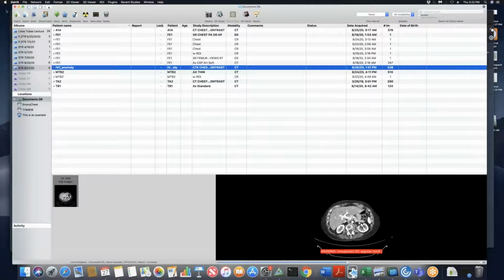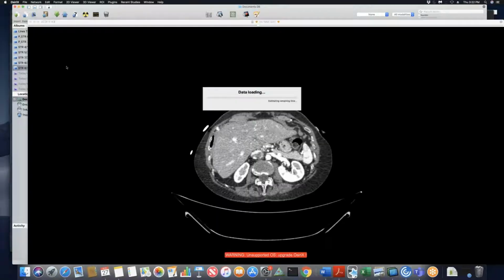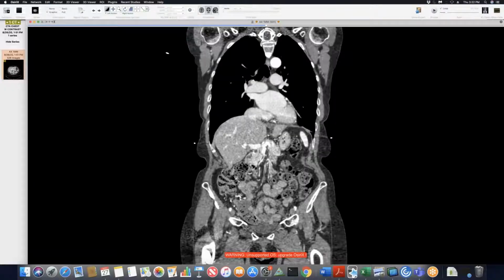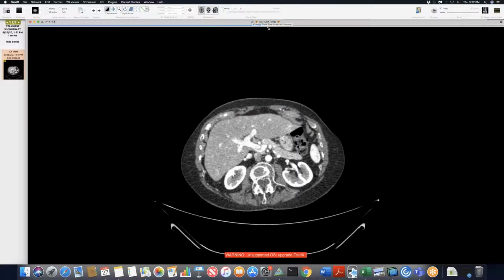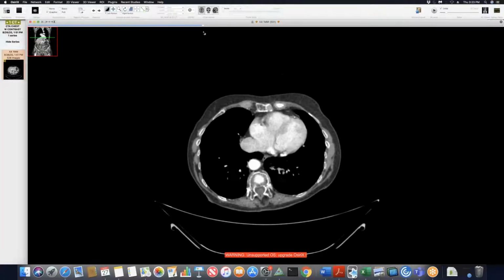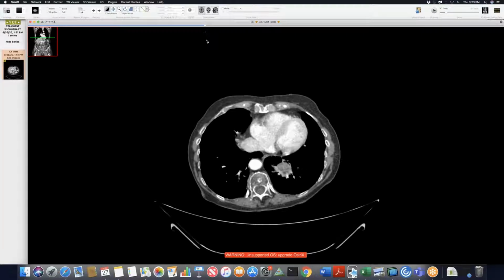Does it connect to the coronary sinus or not? The coronary sinus is right there also. Let me just pull that back up. So it seems like they're all right next to each other.